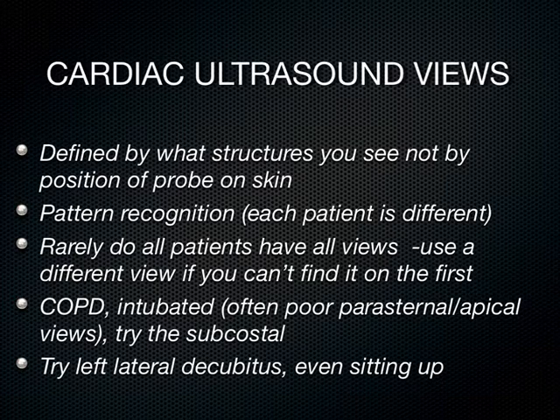And so that's why patients who have COPD, who are intubated, often have very challenging parasternal or apical views. And you watch a cardiac sonographer do an ultrasound. They always roll the patient. They stick a pillow under their right scapula, roll the patient left lateral decubitus, which brings the PMI to the chest wall. You can always get better views if you roll the patient to their left. That's the big secret here.